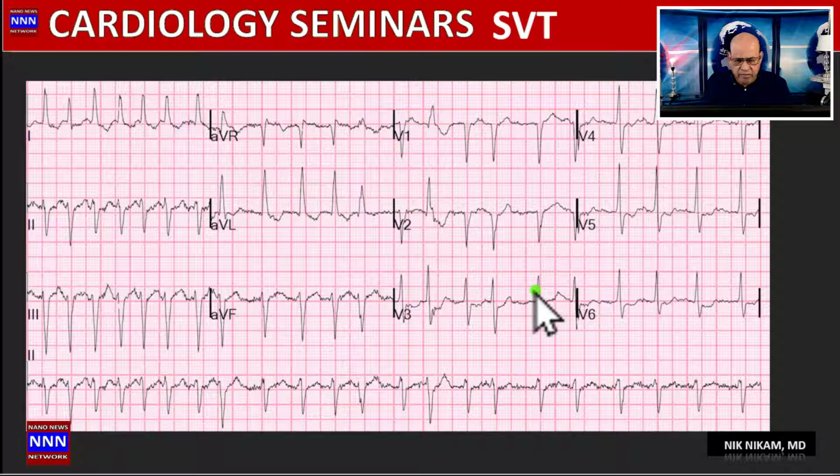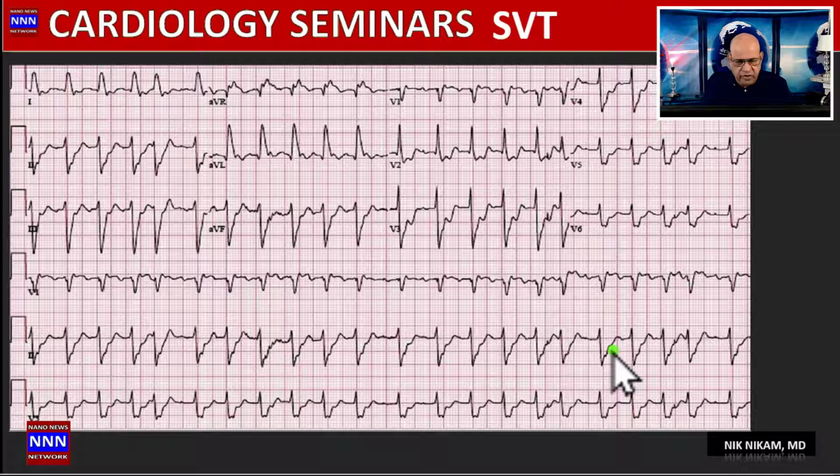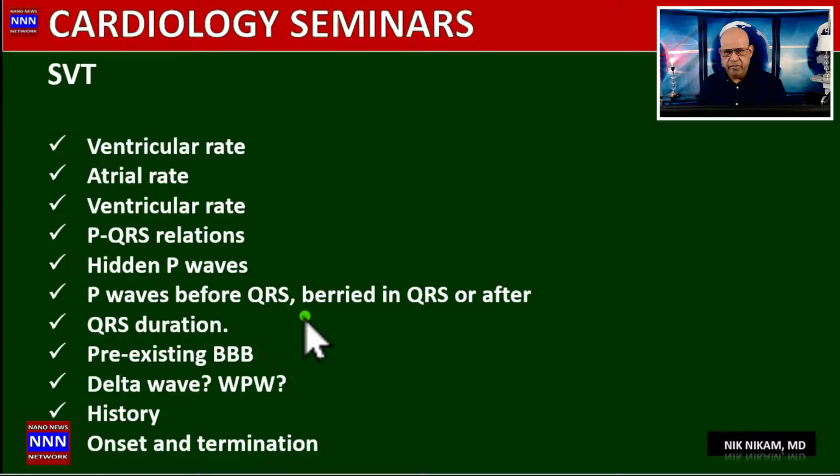Here's an electrocardiogram. You got 30 seconds. What is your diagnosis? Here's the next one. What is your diagnosis? Whenever we are looking at electrocardiograms, we not only look at the rate, but we also look at all the other features, the entire electrocardiogram. So it may give us clues as to what's happening inside the heart. Okay, what is your diagnosis here? Attempt at diagnosing a supraventricular tachycardia.